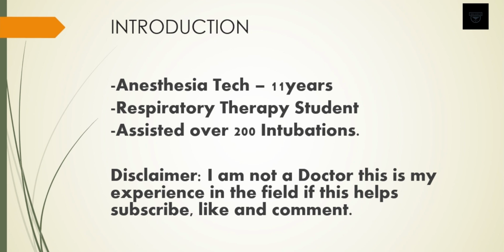And in this video, we're going to share with you guys just some equipment, some tips that you guys can check with intubation just to make sure you guys are prepared. Disclaimer, I am not a doctor. This is my personal experience in the field, just for information purposes only. Okay, so let's get into it.